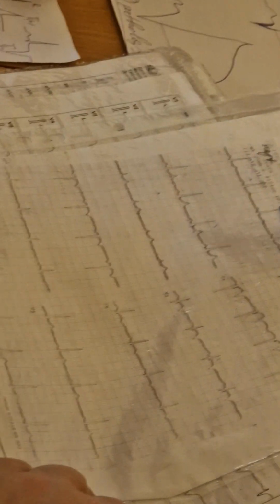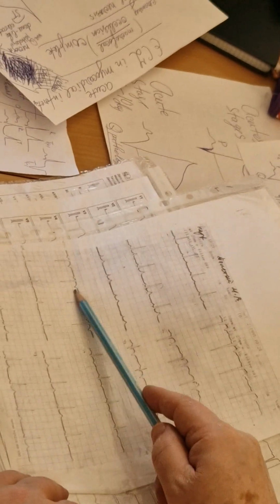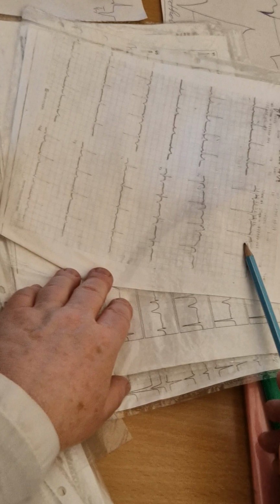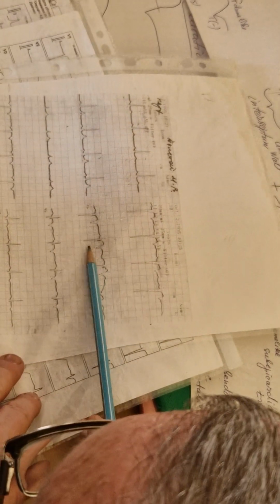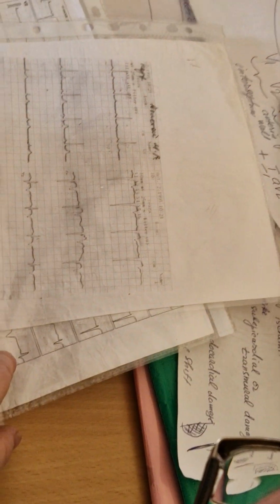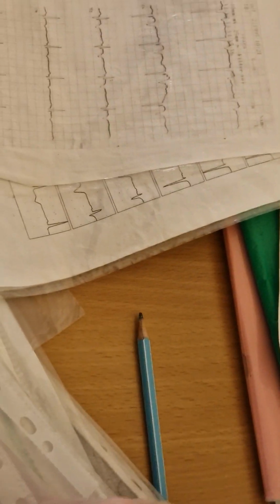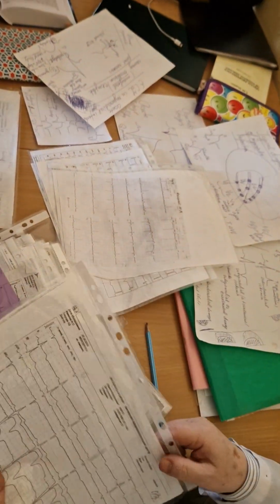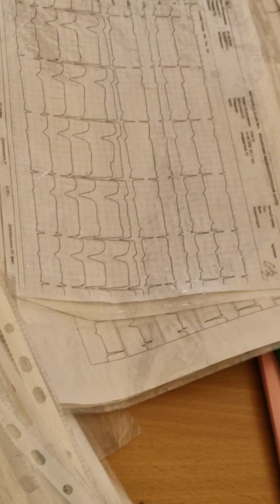To see this: Levogram, you see. Standard leads near normal. What here? ST elevation, T negative, Q wave, R wave not present. And here Q wave, septum, with V1-V3. And anterior wall left ventricle infarction. Here I show similar. I think you find.